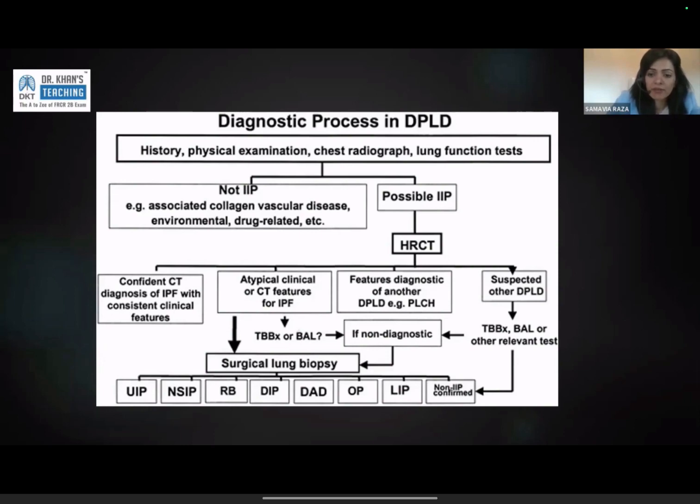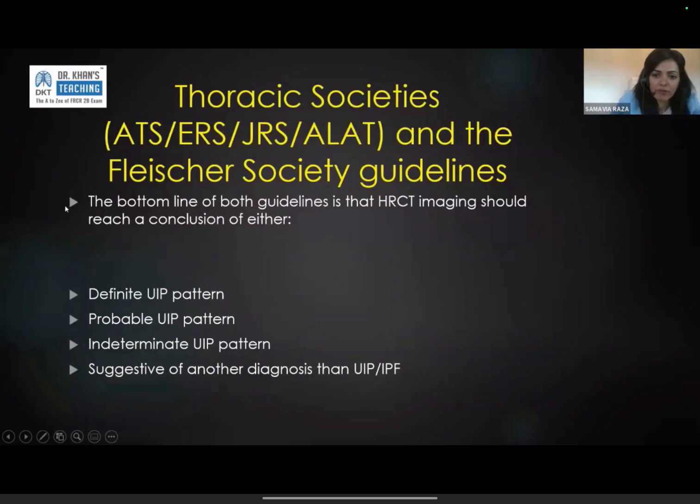Is expiratory phase needed to diagnose air trapping? Absolutely. If you're going to label somebody as chronic HP, an expiratory scan is absolutely necessary. Sometimes that happens at the time of the initial scan. It depends on your protocol. So if the patient was being worked up for ILD and they had a scan requested specifically for HRCT, the initial broad assessment for underlying ILD will include an inspiratory spiral. It will include an interspaced expiratory. Some countries, for example, the American guidelines even recommend a spiral expiratory. We in the UK don't do that.